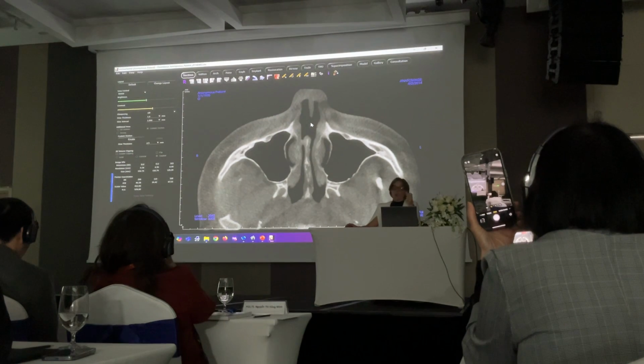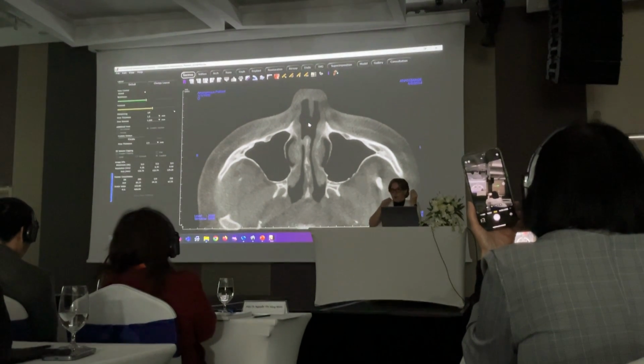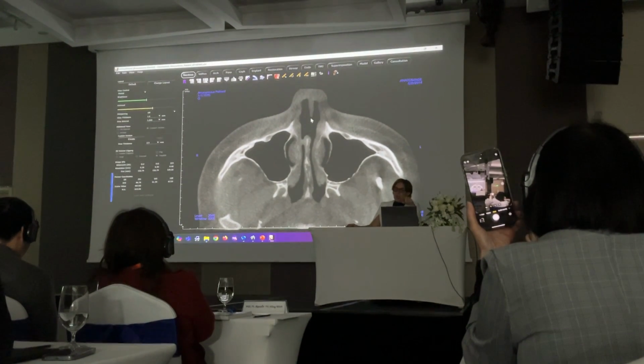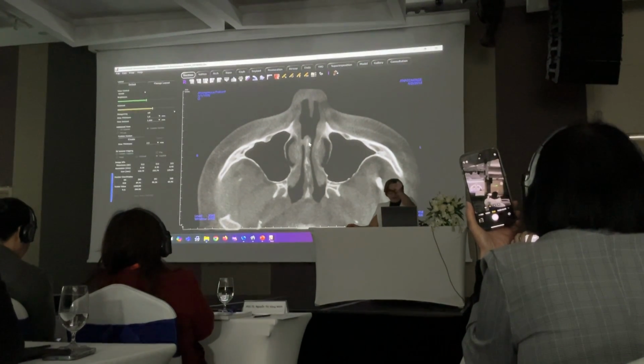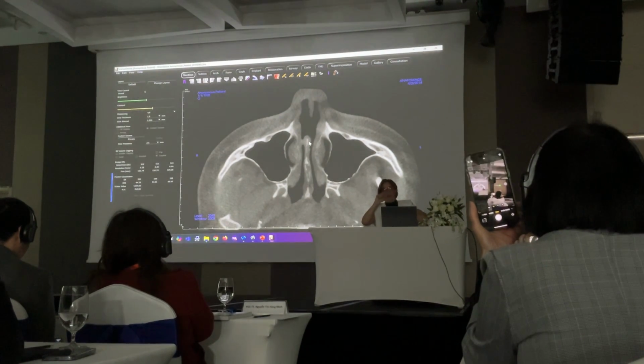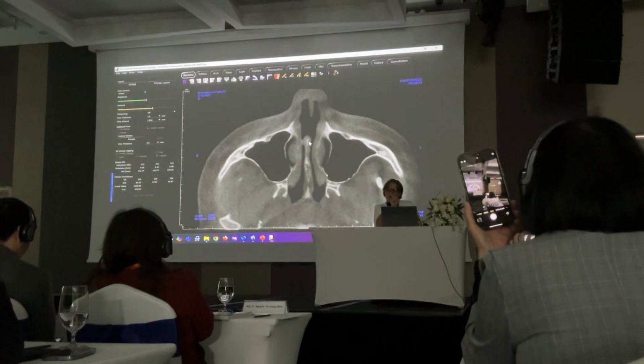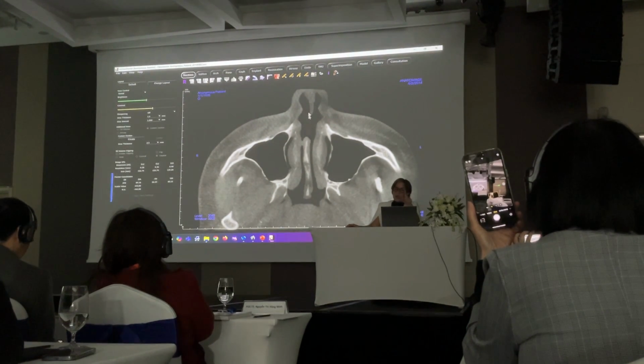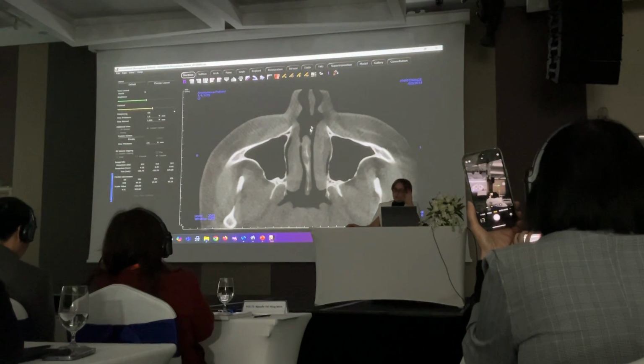Okay? So the use of cocaine into the nose, any drug that you inhale has a vasoconstrictive property, and it can kill the underlying cartilage by cutting off the blood supply due to that vasoconstriction. Also nasal sprays for sinusitis, you have to be careful with those and direct the spray outwards and not inwards so that you don't create this kind of a situation, okay? So here is a lack of continuity of the septum, which is a finding.